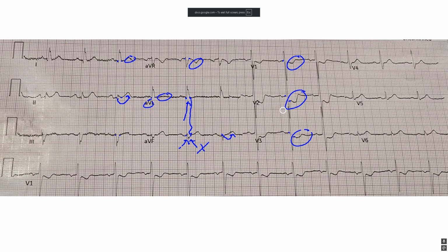So according to the American Heart Association, ST depression in these 2 contiguous leads can be consistent with a posterior infarct. So this already, off the bat, will qualify for an infarct based on the American Heart Association's criteria if we do a posterior EKG. Okay, you can't just say, hey, there's ST depression, posterior infarct. According to the American Heart Association, you have to do a posterior EKG to confirm that.